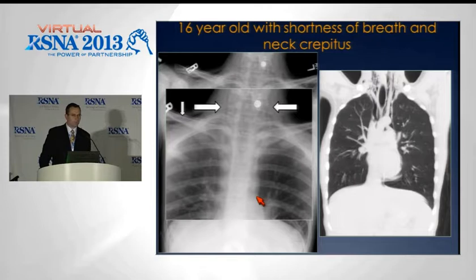But what I think is remarkable, and I find this somewhat frustrating, is the degree of pneumomediastinum that you see on the CT scan that is so hard to see on the radiograph. And what is occurring here in a patient with asthma is during their asthma exacerbation, they rupture an alveolar sac in the periphery. That air is tracking backward along the bronchovascular bundle, is then tracking into the mediastinum, then tracking up and into the soft tissues of the neck. This is called the Macklin effect.